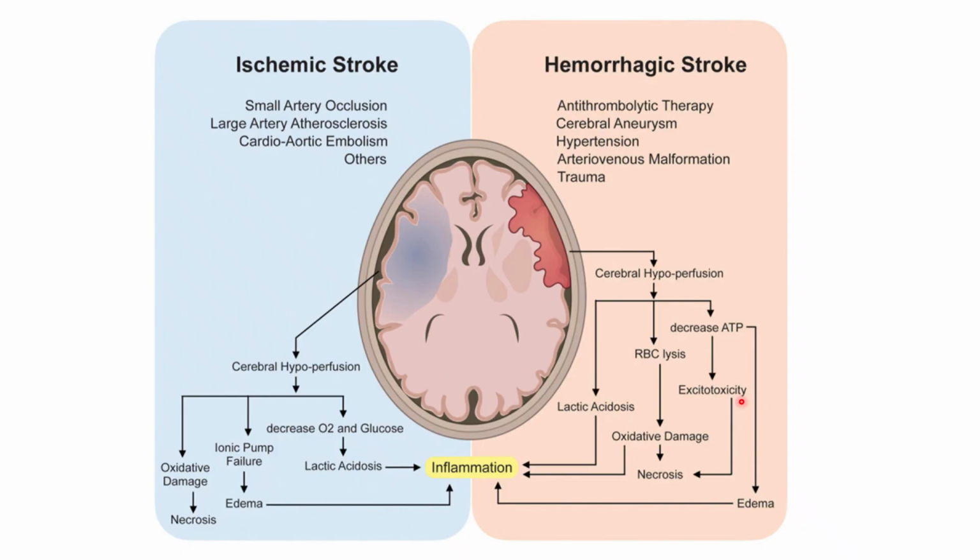Inflammation is yellow on here. If it wasn't already highlighted, I would highlight it to point it out for you. FDG is going to go to inflammation, and there is inflammation that occurs after a stroke. That makes it really hard to actually image the stroke and get accurate results. And so that's one of the major pitfalls.